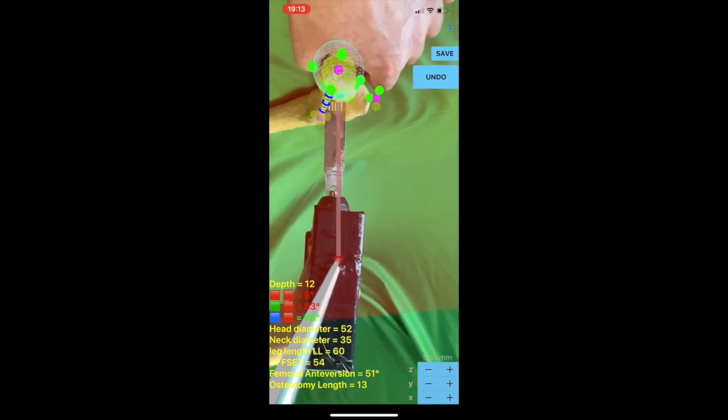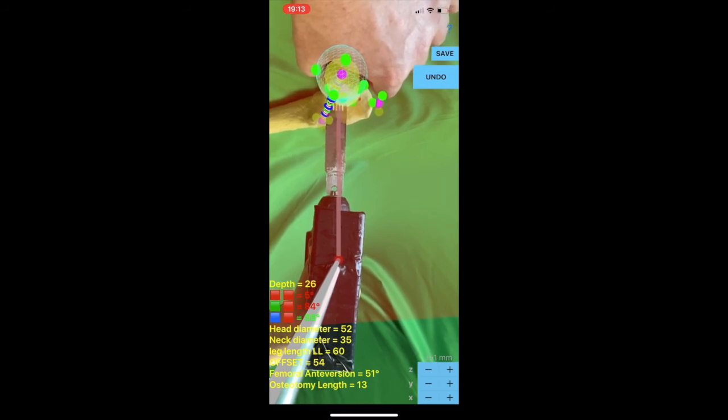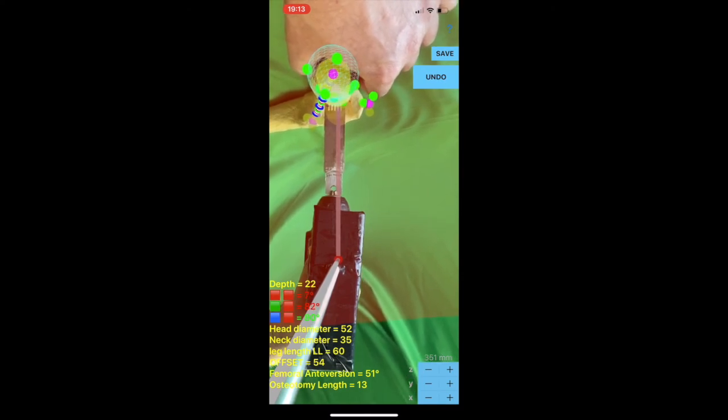The row with blue tile by red tile represents the angle subtended by sagittal plane, blue, of the blade saw and the coronal osteotomy plane, red. Angle values in real time are printed in colors on the screen. Whenever the values fall outside the normal ranges, angle values are printed in red color so the surgeon can be guided more easily, seeing screen indications in real time and directing by hand the bone saw blade more precisely, thus avoiding suboptimal cuts of femoral neck resection in space.